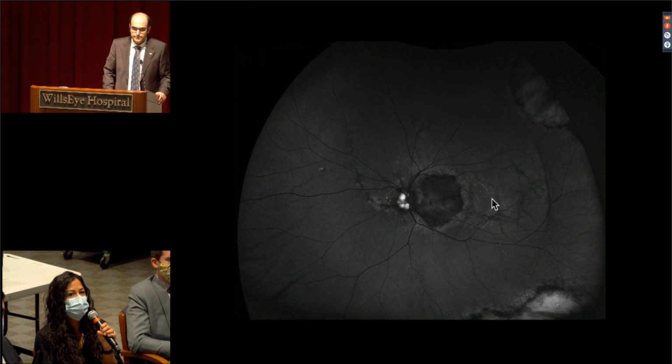And then looking at those areas of the scars, inferiorly, we see this increased signal down here. Again, you can see the buckle ridge here as well. And then another linear hypo signal correlating to one of those streaks out here in the nasal periphery.